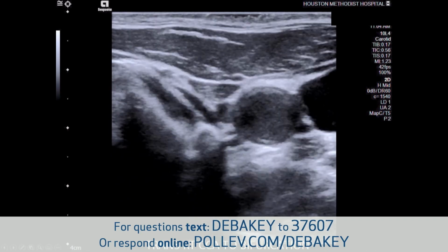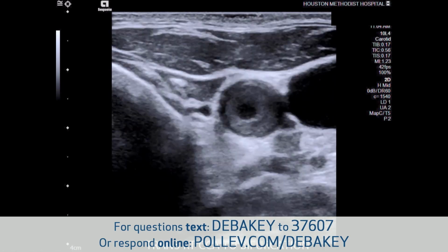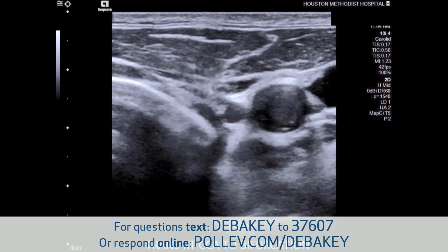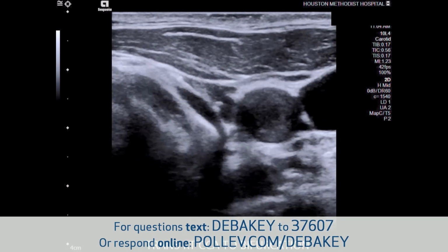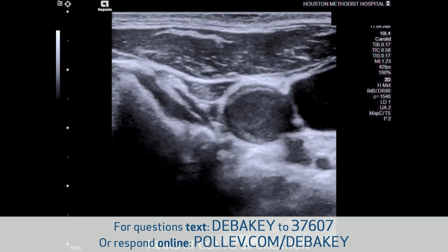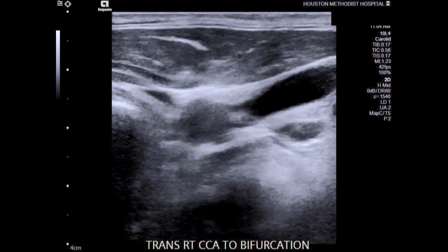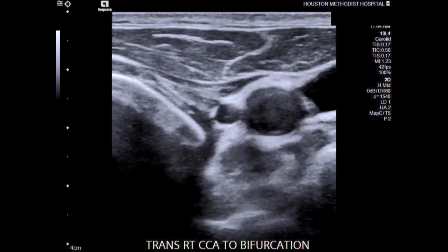So my next case, it's quite interesting. It's an 81-year-old gentleman. And again, we know about a known carotid disease, and medical history with hypertension, coronary artery disease, and a former smoker. And we know that what you see is diagnostic already on the first image, that is definitely a new finding, and 8 years ago wasn't there.